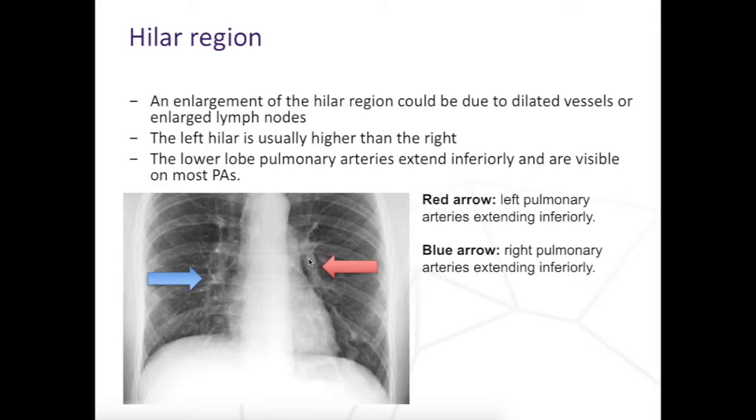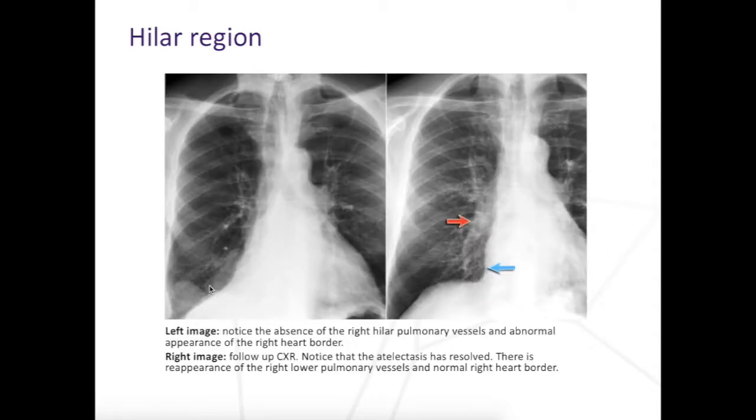This big vessel here is the pulmonary arteries, can be pulmonary veins. It is literally impossible to differentiate, and likewise the same with the other side. Like I mentioned here, you need to be very careful of identifying the vessels.